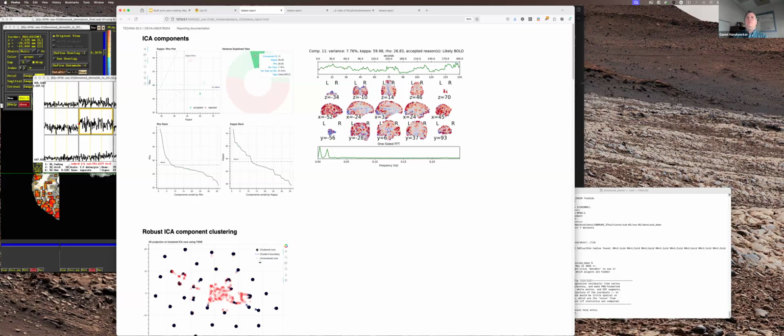And this one has 30% overlapping with rejected. So you can see there's some variation, and I think it's a good measure. This component is only 25% variance explained by rejected, so it's much more signal. It's another number we just threw into the program that I think might help interpret a little more what's happening here and there.